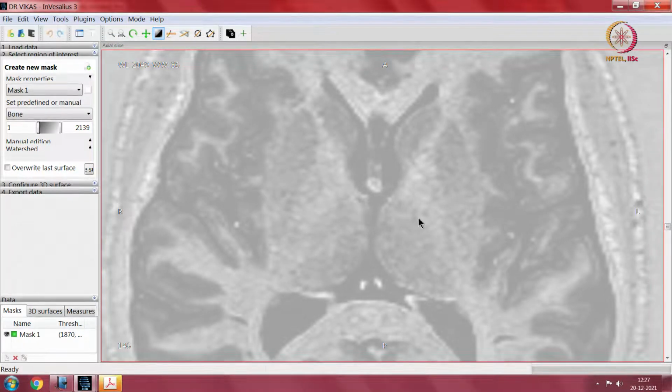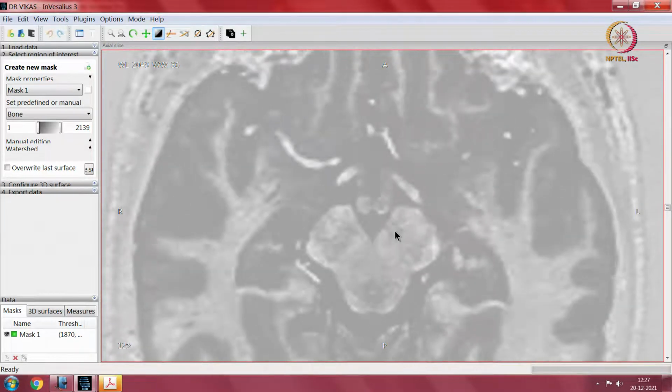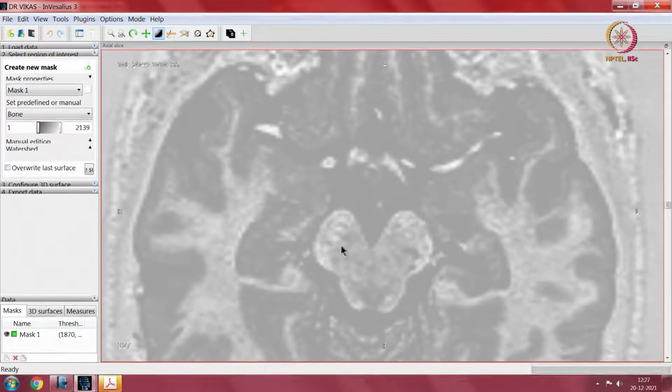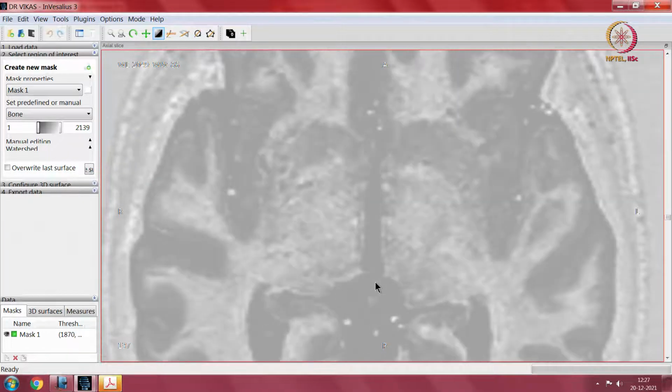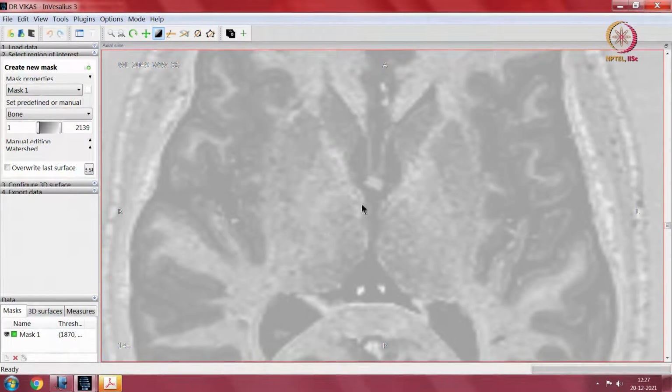Yeah, so right. The first structure which I want to teach is the thalamus. Two thalami on either side. This is the egg-like shaped structure over here. The thalamus is almost in continuation with the midbrain. When you come up, this is the midbrain, the shape is very obvious, two cerebral peduncles, aqueduct behind. When the cerebral peduncles come up, you would find the thalamus, it is obvious over here.